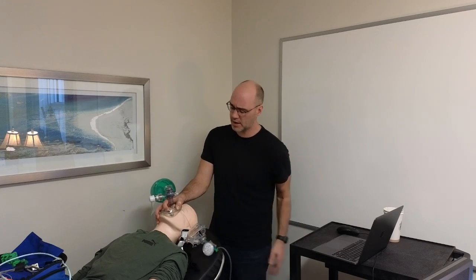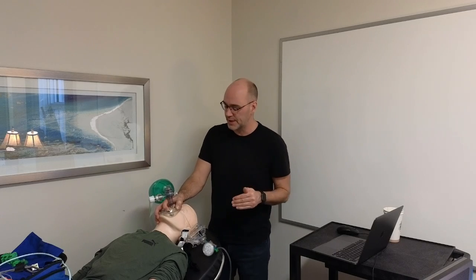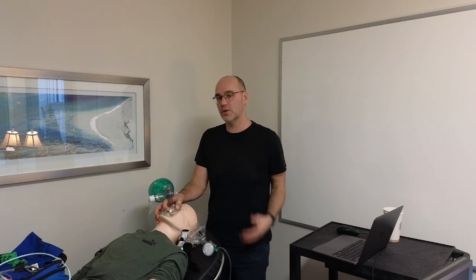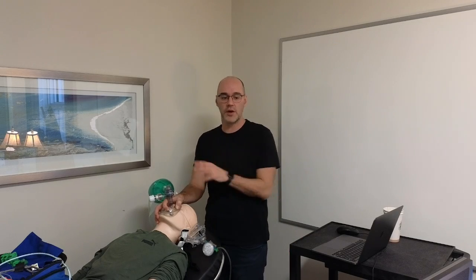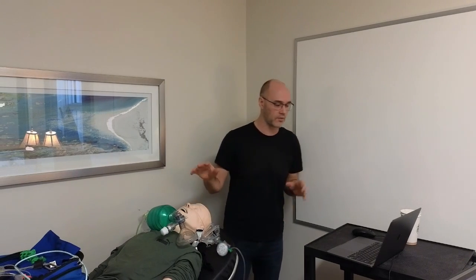But why Scott Weingart has advocated this is largely around pre-oxygenation of the patient before intubation. So if you're having a hard time oxygenating your patient up to 100%, despite good ventilation and appropriate end-tidal CO2, whether that be the patient themselves or others, he advocates that you could try this. So it fits into our discussion in that context.